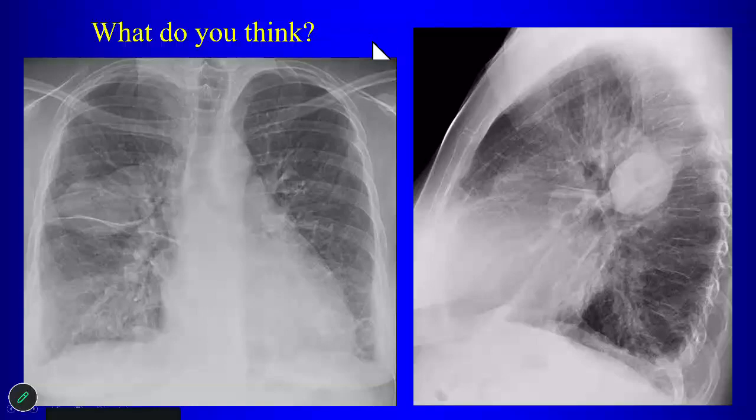So this case, who wants to discuss this? There's a right lung opacity with a linear hyperdensity on the frontal image going through it. It's lower density on the frontal than it is on the lateral. Because of its close approximation to the minor fissure, this could represent fluid within the fissure. What do you call that? Pseudotumor. Do you see the minor fissure on the lateral? Yes. Is that the anterior minor fissure?